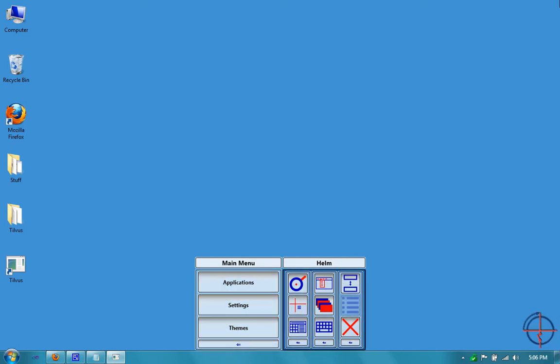This software was designed to help quadriplegics use a computer with any single switch, like a head switch or a sip and puff switch. So everything you see here is being done with just a single button. And for that I'm going to have Matt, another person on our design team, use the button to show some of the key features to navigate through.